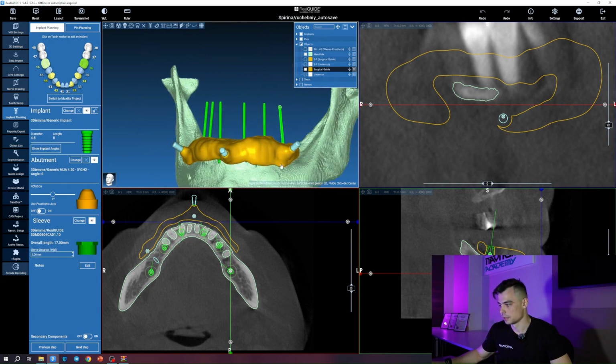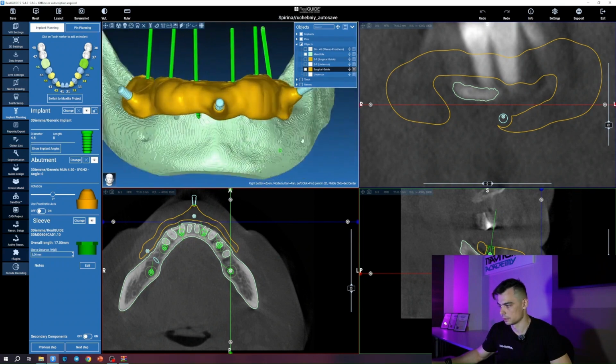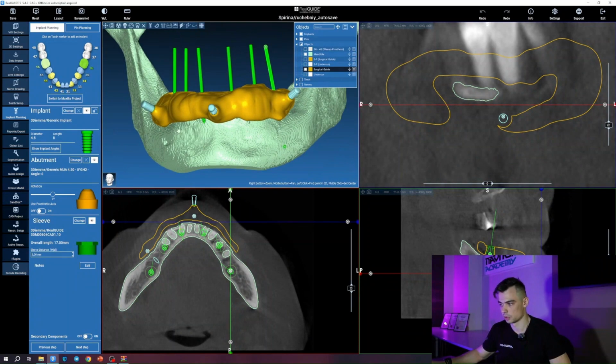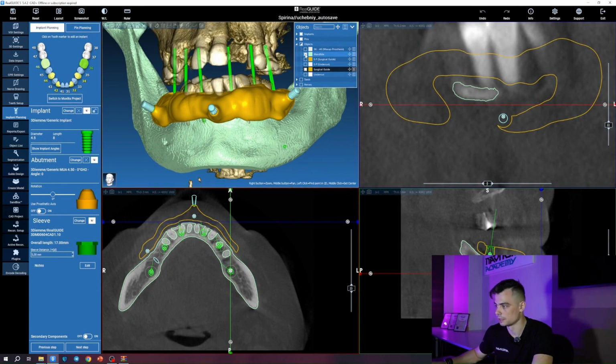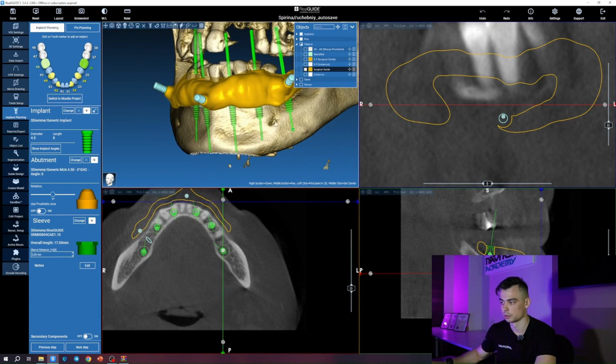Here, yes, I'd like to make a slight adjustment. There's also an important point I'd like to mention regarding this whole process, especially concerning the lower jaw and working with the bone in general. Be sure to also check the exit of the mental foramen. When you work with this type of guide, the guide should never touch the exit of the mental foramen.